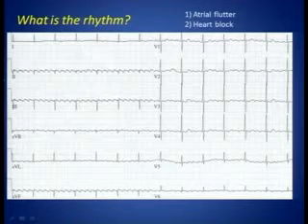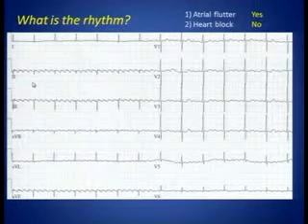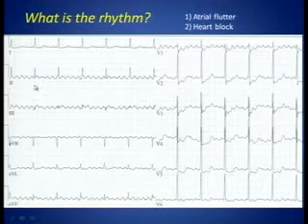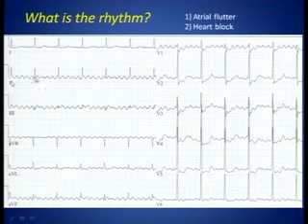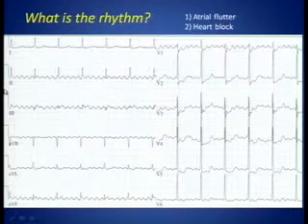They are associated. The next one I showed, and this is the critical difference, is atrial flutter in the atrium with a regular ventricular rhythm, but the relationship between A and V is not constant. If there's conduction and they're both regular, there must be a constant relationship. If the relationship is not constant, it cannot be conducted.